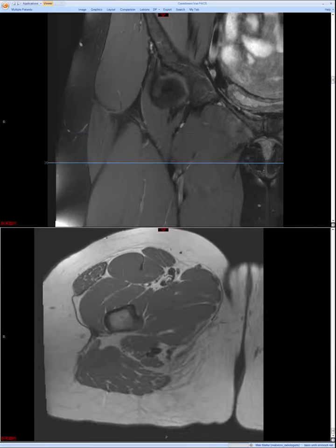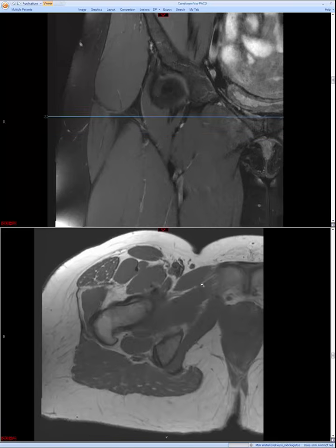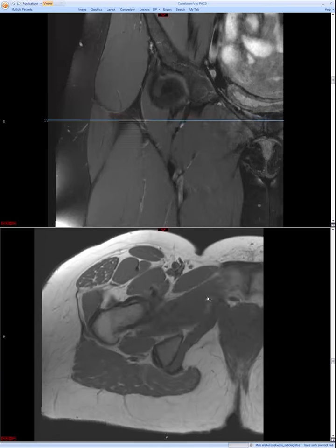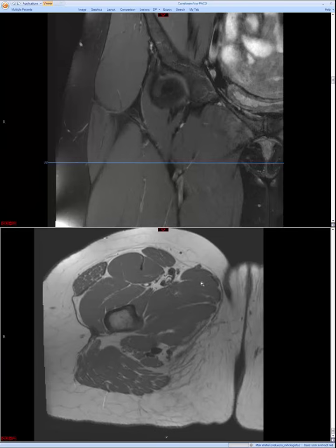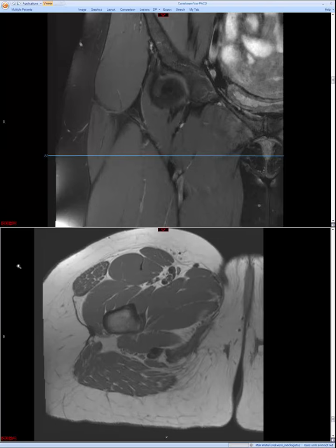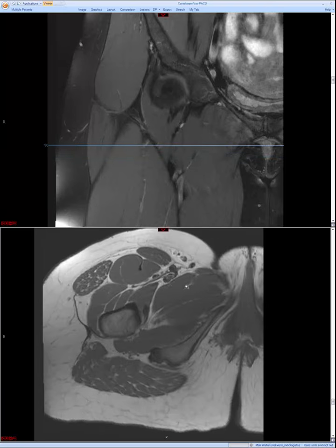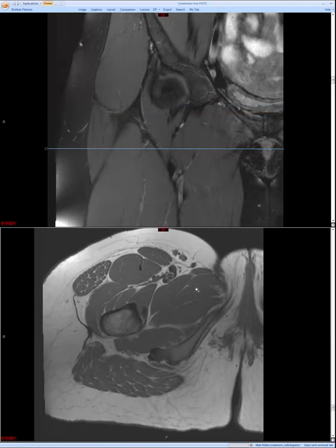So to my knowledge, there's no easy way to remember all the adductor tendons and muscles here. So going from superior to inferior, the most superior one is going to be pectineus, and then as we scroll more inferiorly, it's just going to be adductor longus, brevis, and magnus. Longus, brevis, magnus. And again, sorry, I don't have an easy way to remember that, but I wouldn't be surprised if on the next OSCE you get this, and then they go ahead and label all this stuff here. So longus, brevis, magnus, and pectineus, the highest one up here. And also the anterior and posterior divisions of the obturator nerves will separate the longus from the brevis and the brevis from the magnus.